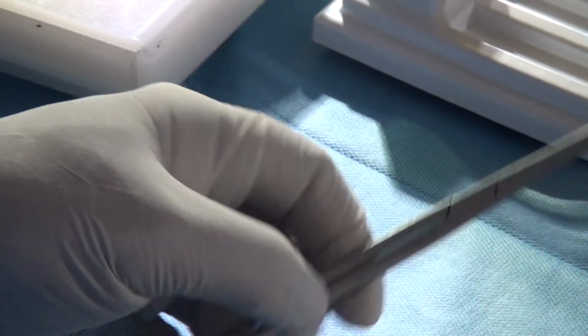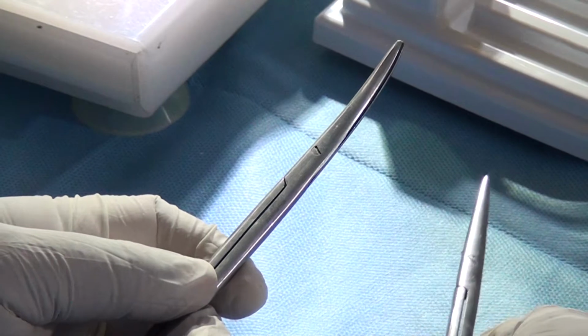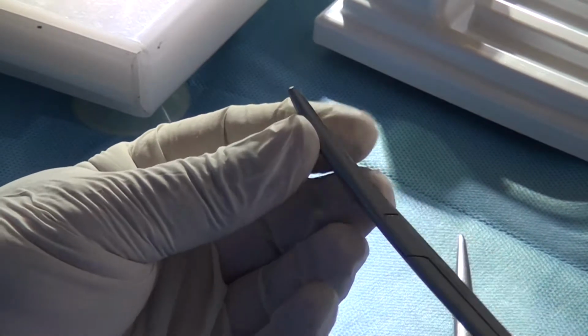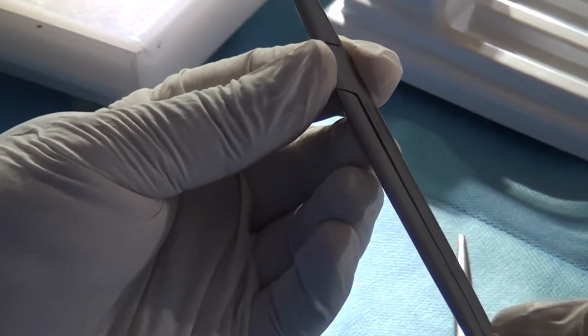The straight and curved scissors are for a different purpose. Curved scissors is because you want to see what you cut. You want to cut what you see. Therefore, the curvature, the tip, should be looking at you or up. If somebody asks you how do you hold the scissors, you hold it with the tip towards you or tip up. That's the key.